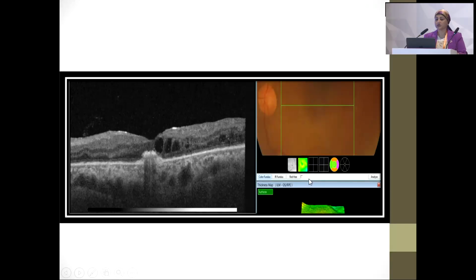of the macular edema. And in this case, to see the hyperreflective shadow in the outer retinal layer, disturbing the complexes of the ISOS junction and the Bruch's membrane choriocapillaris complex with the high reflectivity, denotes that even after the treatment and the cystic macular edema response, there is a bad visual prognosis due to this disruption of the outer retinal layer.